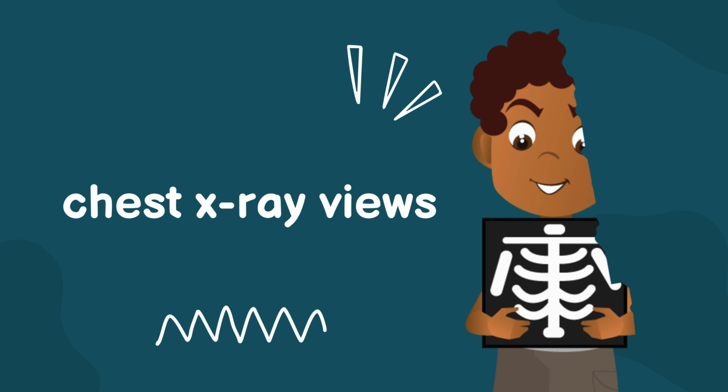Welcome to this video on chest X-ray views. In this tutorial, we'll be exploring the different types of X-ray views used to evaluate the chest, and when each one is preferred. Whether you're a medical student, a healthcare professional, or just someone interested in learning more about diagnostic imaging, understanding these views is key to accurately interpreting chest X-rays.